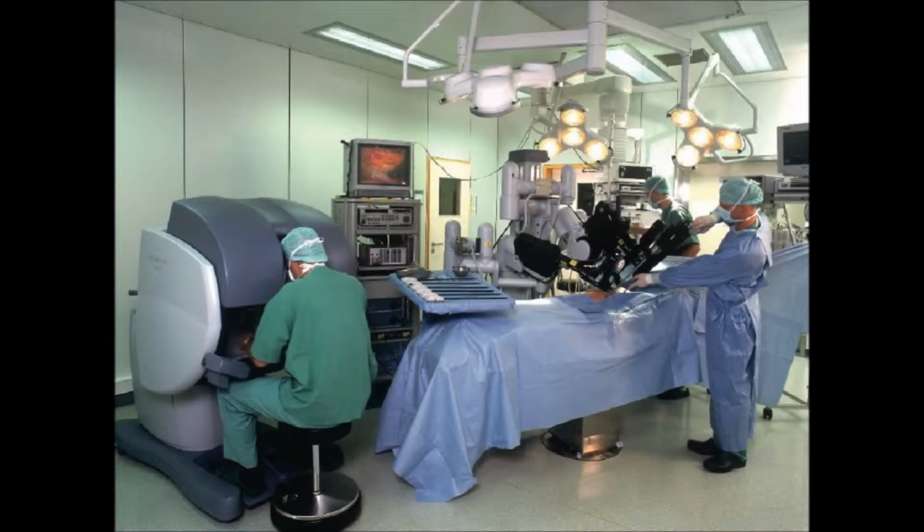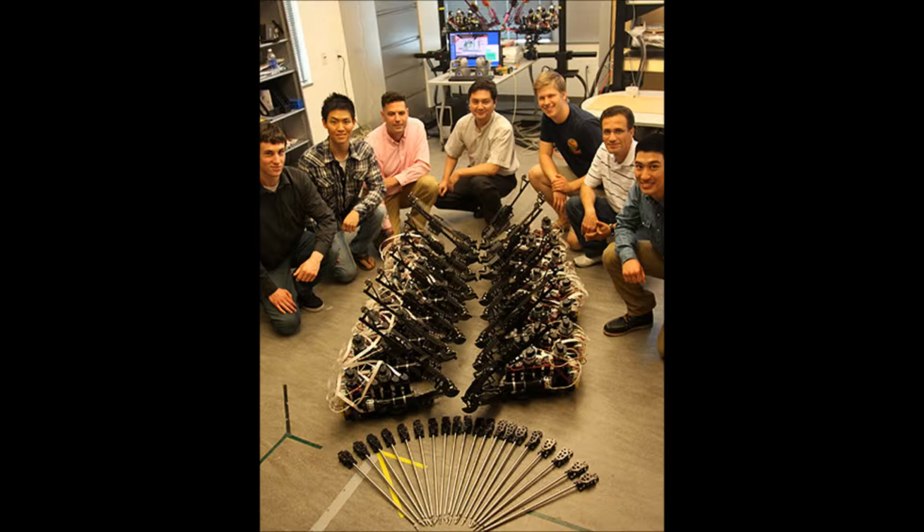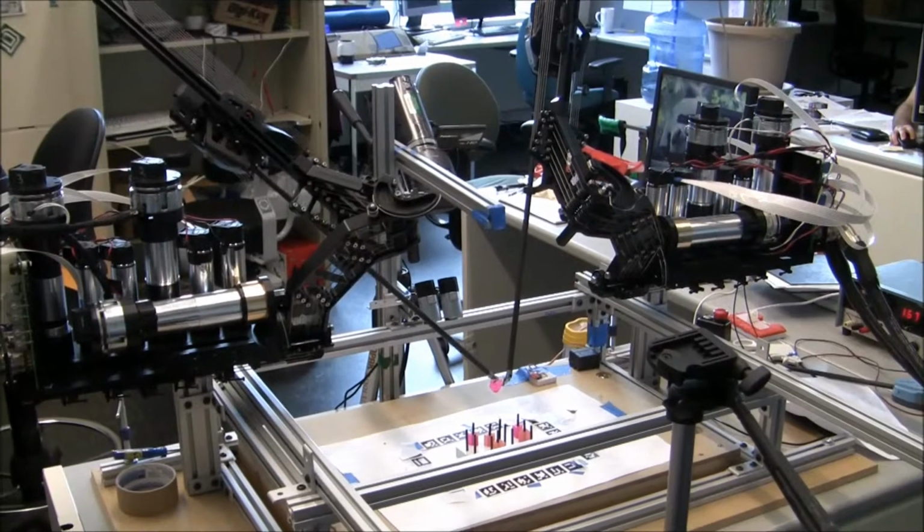Currently, there is only one FDA-approved surgical robot in use, the Da Vinci Surgical System. The University of Washington Biorobotics Laboratory has developed a new robot, the Raven robot. The original intent of development was to create a robot that would be utilized to provide treatment as quickly as possible to injured military personnel.